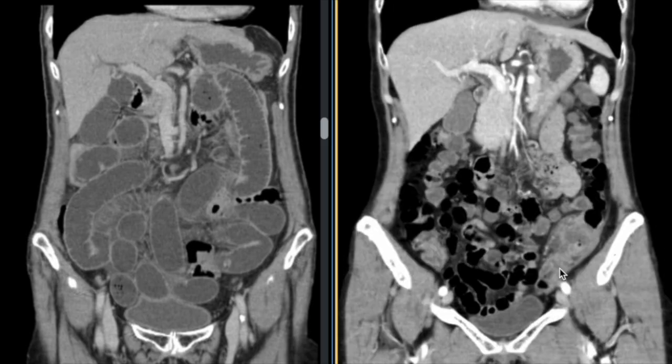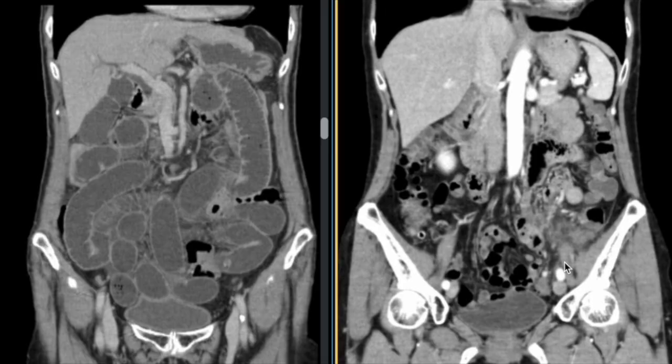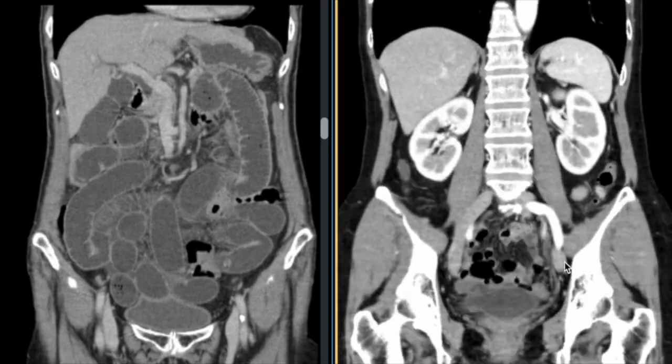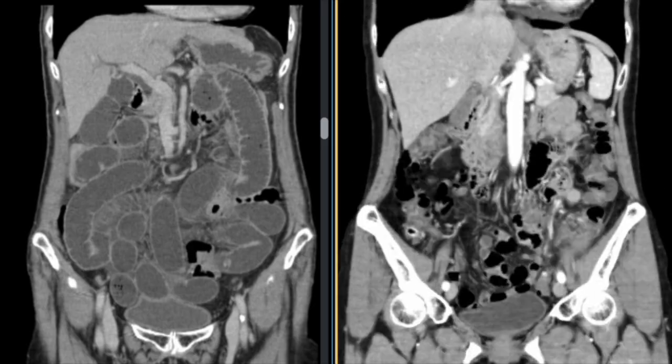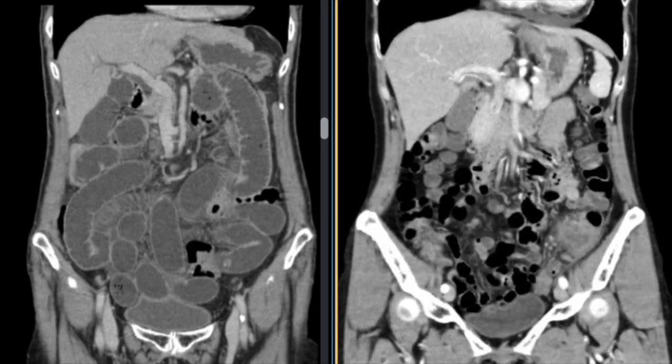It expands and contracts in places, but that's because the small intestine is constantly moving. That's just how it appeared at that moment. If you took another image a minute later, it would look different again.